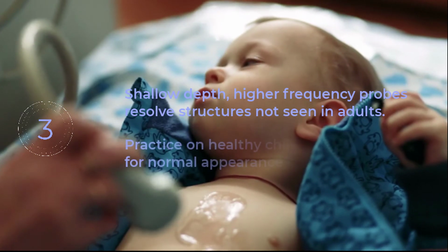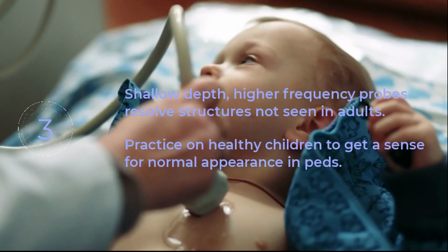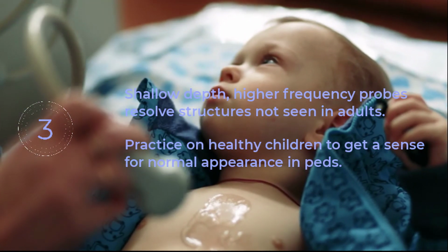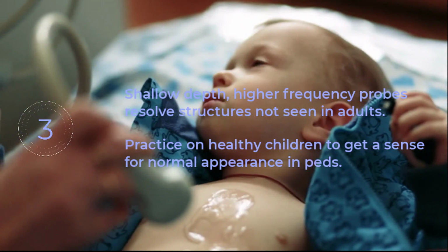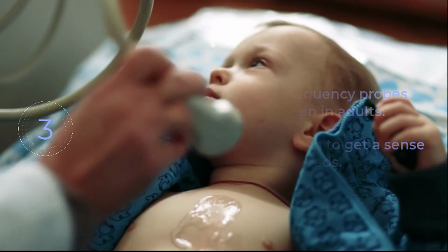Consider using ultrasound in known normal children and children with completed radiology ultrasounds to become familiar with the appearance of pathology and normal variants. Understanding normal findings is key to applying the FAST exam in children with high specificity.